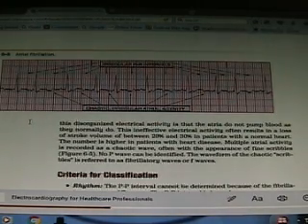So you can see how there's a progression of problems. We started off with what? It kind of looked normal, didn't it? Right? The PAC, everything was normal. All the waves were there. And then the MAT, the WAP, okay, it's a little bit worse. The MAT, okay, now it's getting bad. Then the atrial flutter, okay, that's not good. Now the atrial fibrillation. So you can see there's a progression from not so good to what? Horrific. And the atrial fibrillation is an emergency trace.